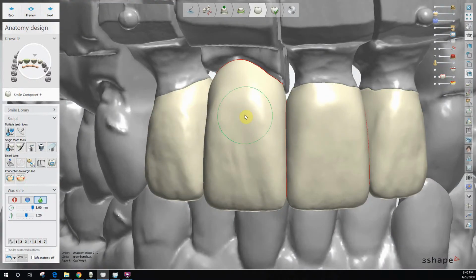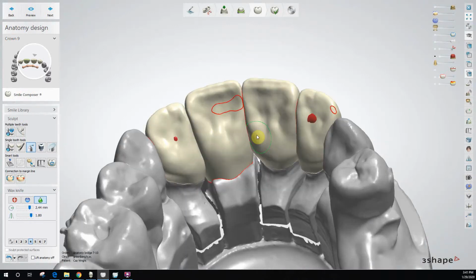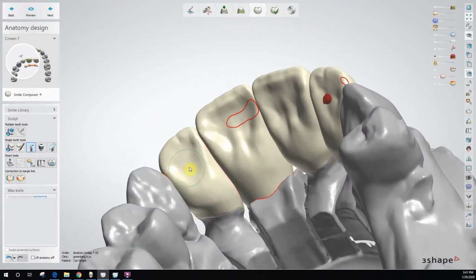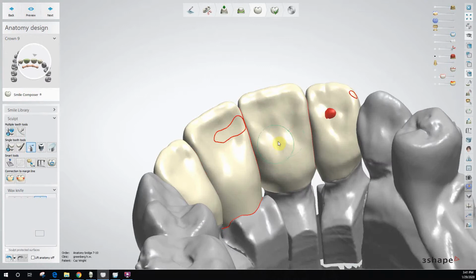Shift always changes the size of the circle, Control always changes the size of the intensity. This is plus, this is take away, this is addition, take away, smooth, okay? I've got them all pre-programmed after designing. They've become individual tools is what they've become. G4 is I'm just cleaning things up, adding a lot of smoothing.